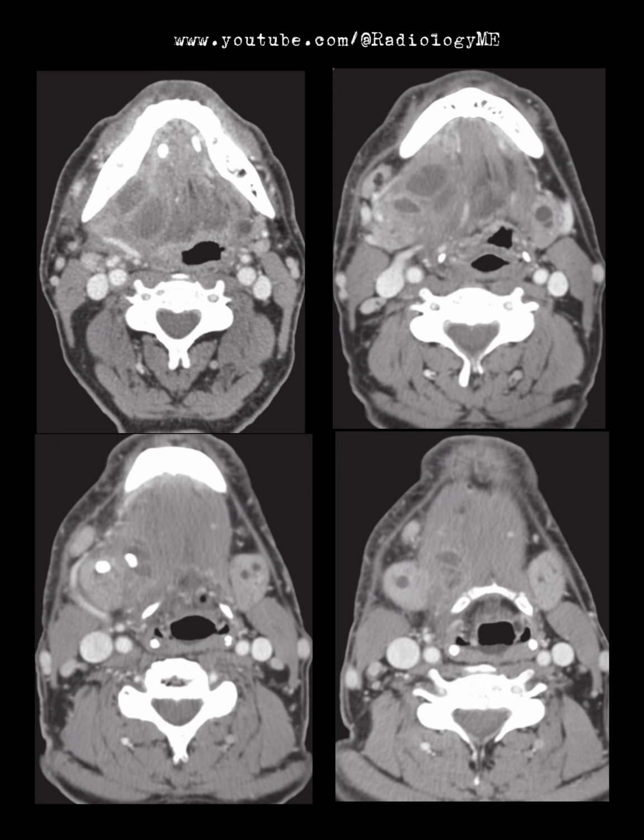To sum it up, this looks like a right submandibular space abscess in an adult male patient, with obstructing submandibular duct calculi bilaterally. The abscess formation and likely coexisting sialectasis are probably all due to these obstructions, leading to infection and abscess formation. Before I finish, let me leave you with this.